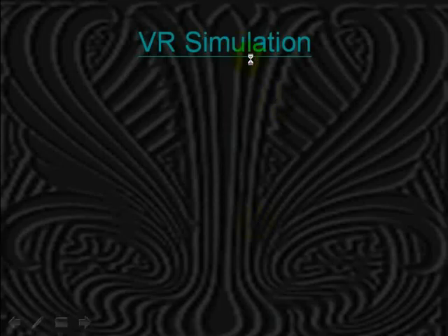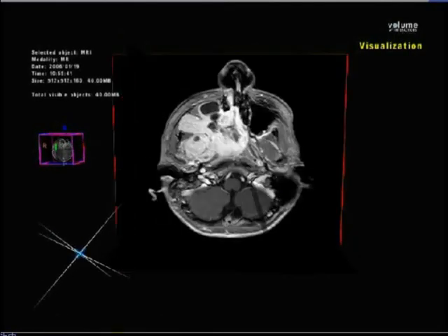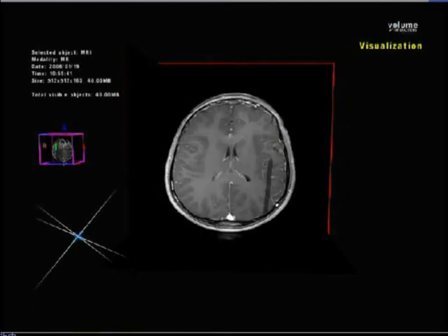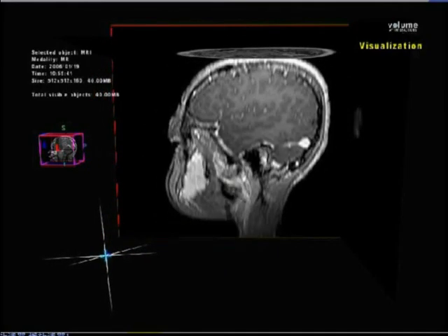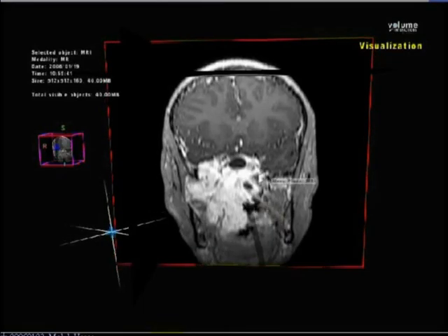So this is the simulation. Again, I wanted to show the anatomical substrate for which we plan our surgical procedure. First of all, with MRs, you can see this lesion in the usual way, and then we try to build a sagittal image after we have gotten to see all this.